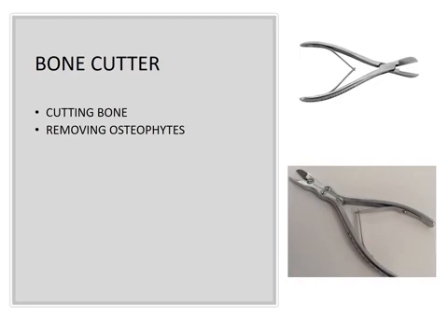Along with it, to cut the edges of the bone or the osteophytes, when osteoarthritis is being dealt with, you have a bone cutter. Bone cutter. It is also used to make small fragments of the bone grafts that you obtain. Bone cutter.